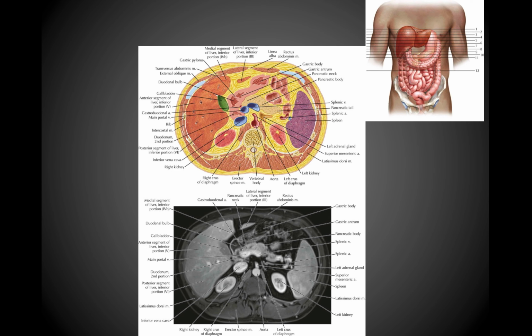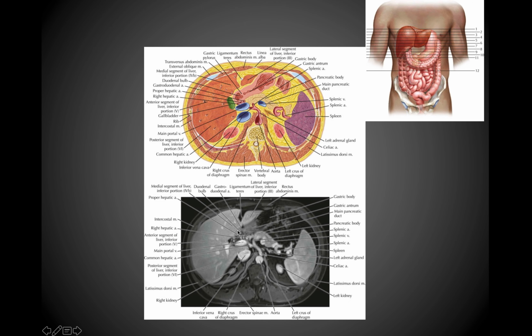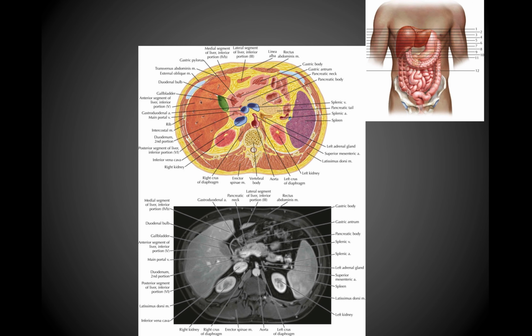All right, moving into the next image. So once again, the gallbladder, you can see a little bit better now in this image. Again, if we go back to the previous one, you can just make out a very small part of the gallbladder, but now we can see it much better in this image here, again located in close proximity to the liver, as you'd expect. You can still see the spleen.